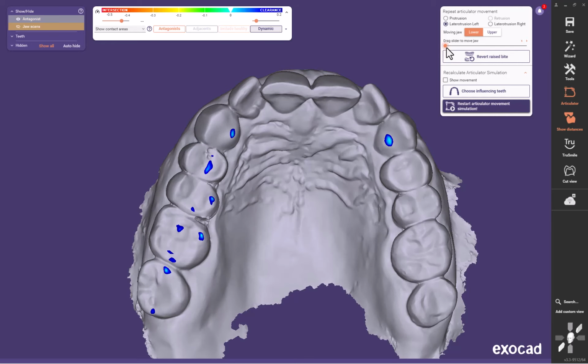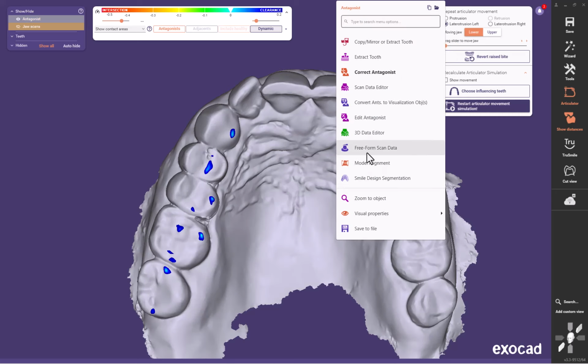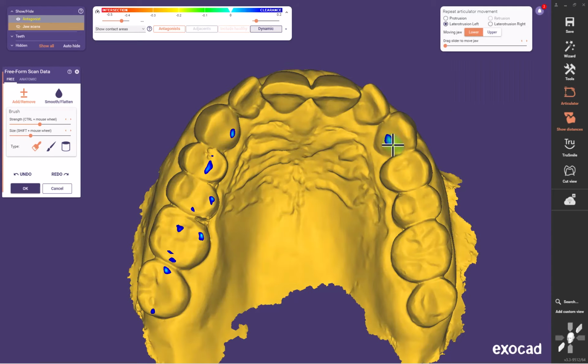Now let's see what's happening in this left motion now. As I move to the left, I still got a little bit of rub over here. So I start sliding left, and I got a little bit of rub. Not bad though. I can play with it a couple of ways.